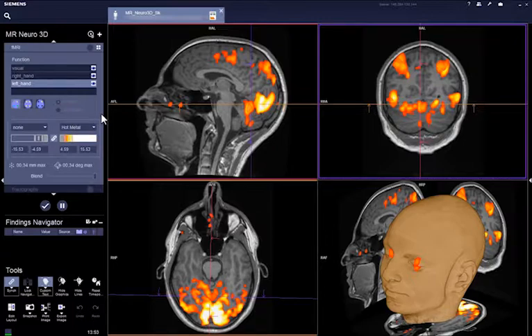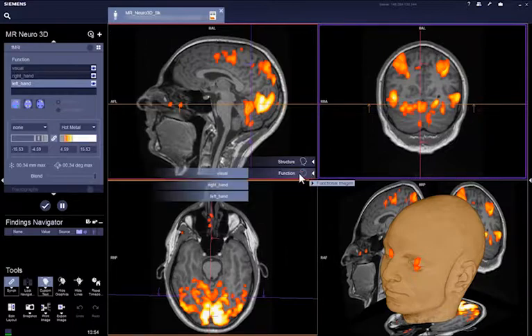Option to use interpolation and to specify cluster size in the Function Properties menu. In the right bottom corner menu, select Function and the wrench of a specific task to open the function properties for this task to activate these functions.